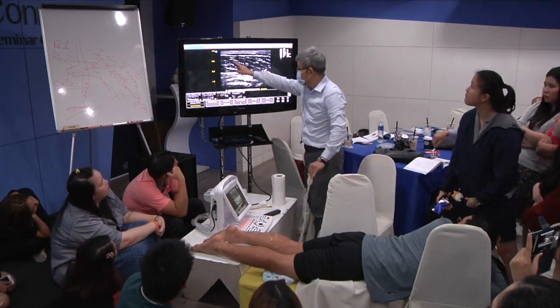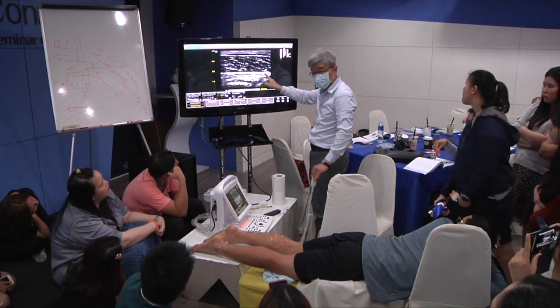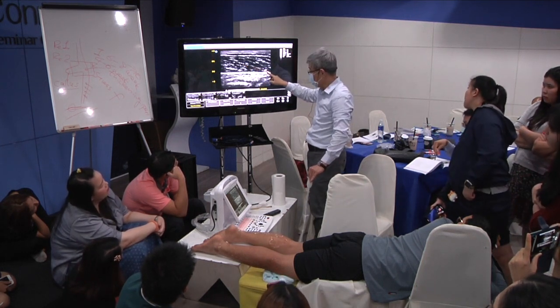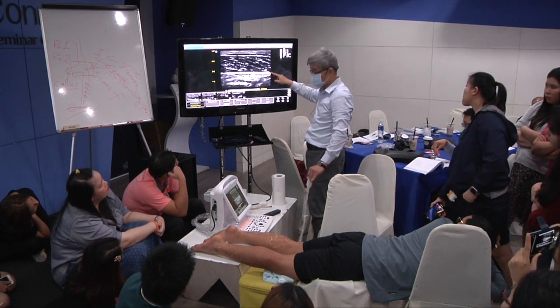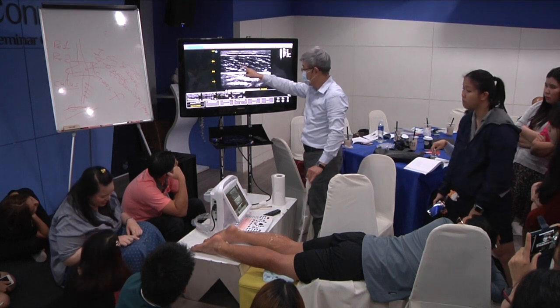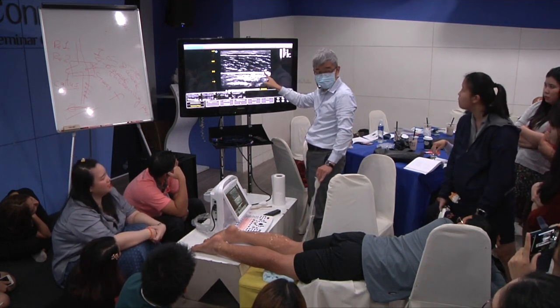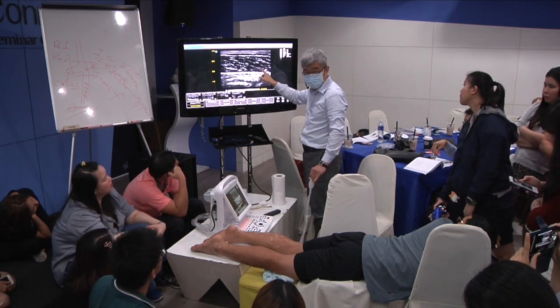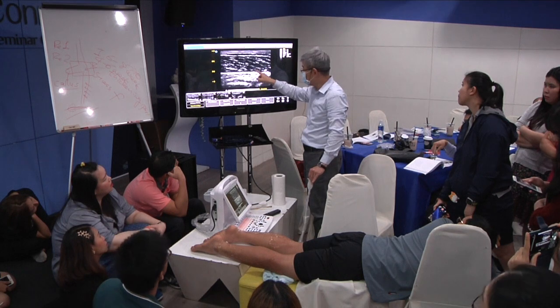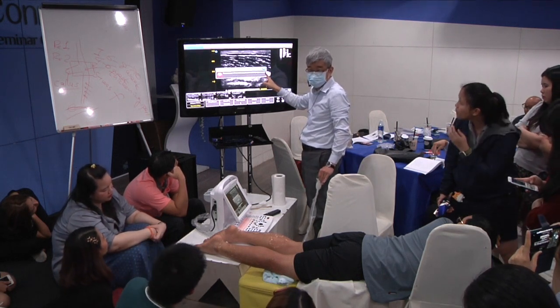The curve is not straight. In the end, it's never straight. Never. The muscle is curved. You have to show at least one of the insertions to please the editor.